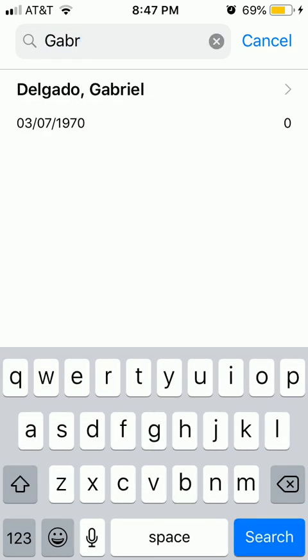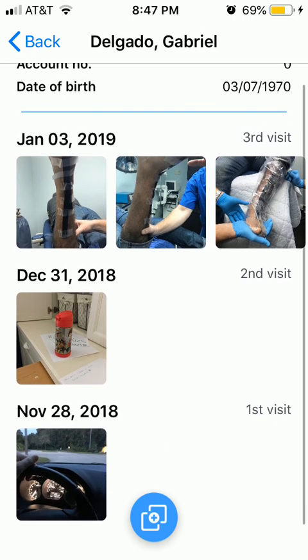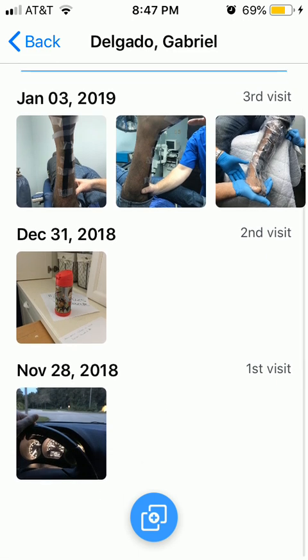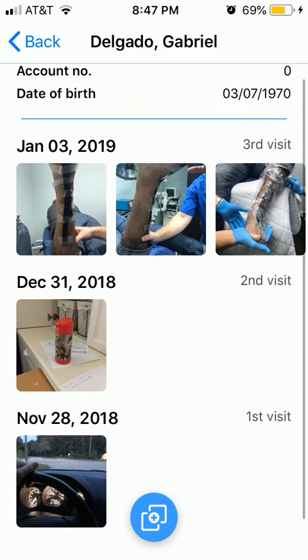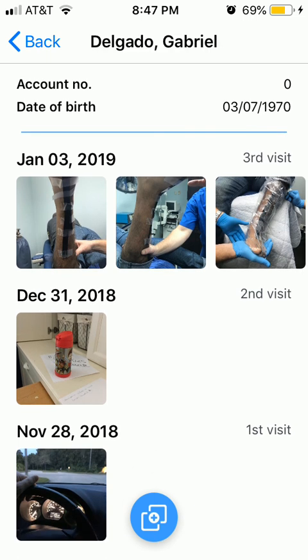and I just want to show you how we organize other images. Some of these other tests, for instance. In my own image, I'm Gabriel. So I'm going to look up Gabriel, and then I can search for me. And as you can see off to the right there, other images that we've just played with are categorized by first image, first visit, second visit, third visit.